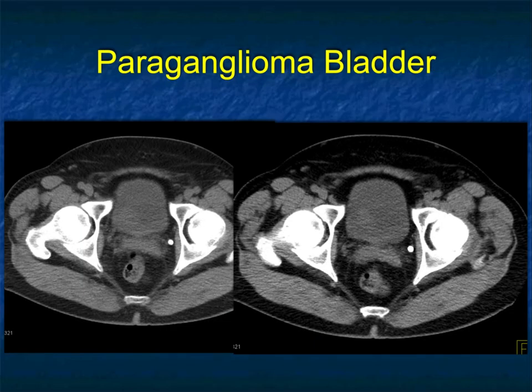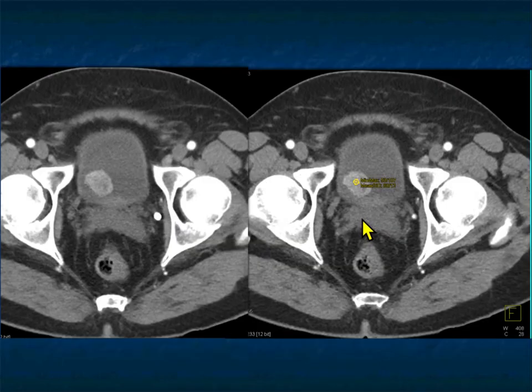Now, I thought I would share with you, because I had a case recently, about paragangliomas. Now, we talk about pheochromocytomas in the adrenal gland. When you have an extra-adrenal pheo, it's considered a paraganglioma. Most common areas, typically organ of Zuckerkandl, but we commonly see them in the paraortic region, but they also can occur in the bladder. Non-contrast scans, a little subtle thing there.